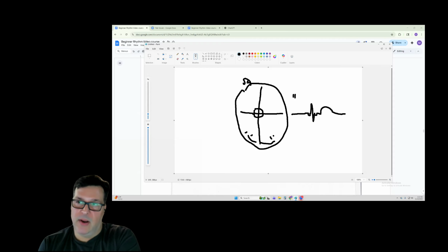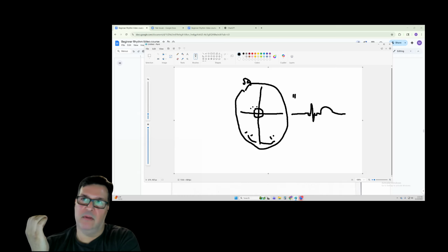So what you're going to have here is an atrial ectopic, where the atrial cells someplace around the junctional area are still low, but high enough to still create a positive P wave because the impulse still flows down that way. To be junctional, the PR interval has to be less than 0.12 and negative.